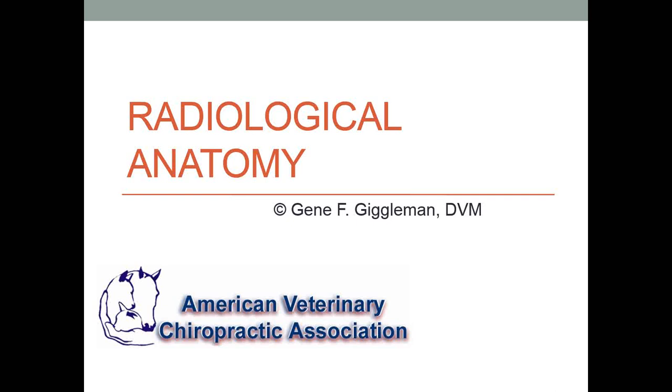This is radiological anatomy. Let me first say before we start that the diagnosis of disease conditions based on radiographs is a thing left for veterinarians. Chiropractors do not make diagnoses based on radiographs. So you might say, why are we teaching radiographic anatomy? The purpose of this is to allow you to be able to recognize conditions.